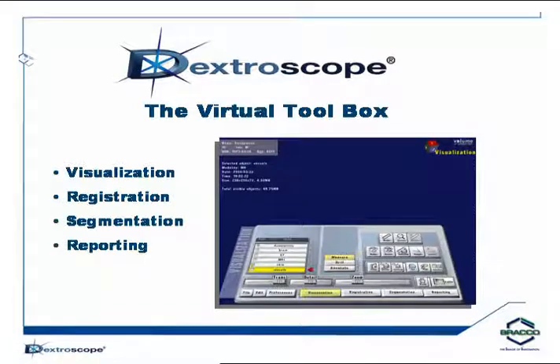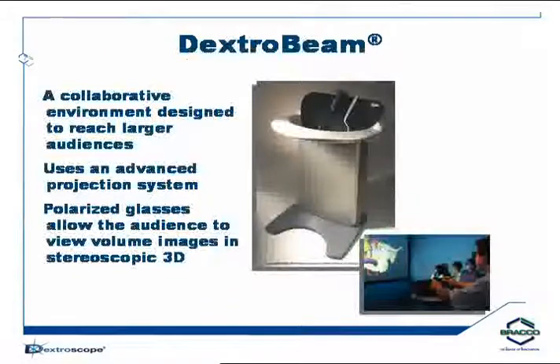So all of the cases that you will see tonight were done on the Dextroscope, so sitting at the console, interacting in this virtual environment. But what you're going to see tonight for a large group presentation is it being done with this Dextro Beam, which is sitting right here, and Dr. Sarah will be operating it live.